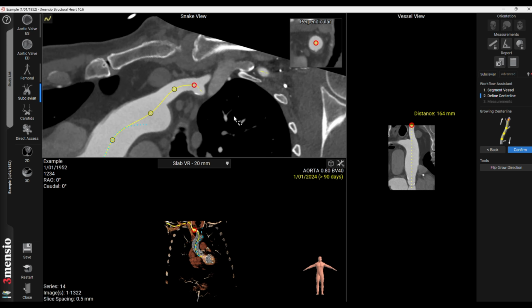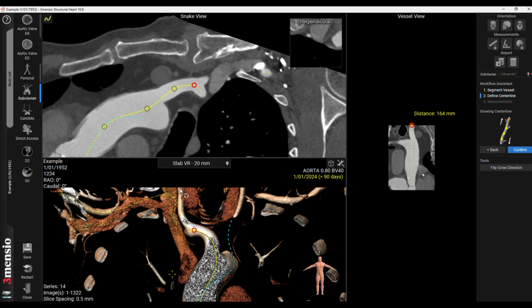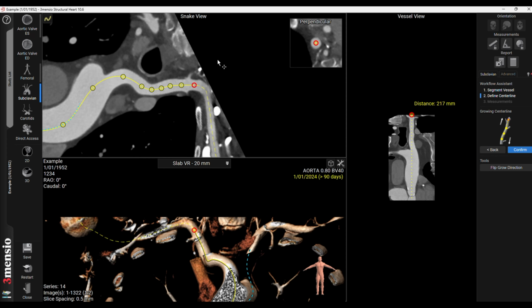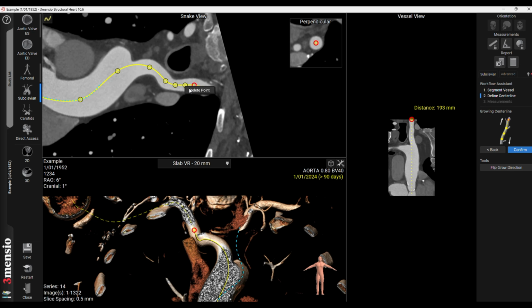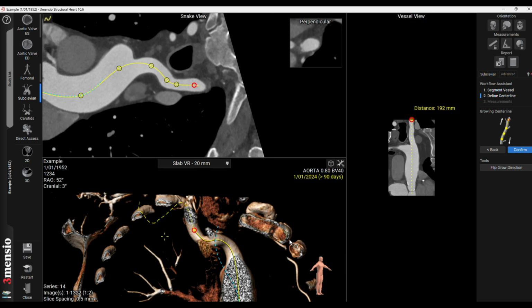And then I'm going to keep manipulating this top image up here to see where the vessel's going. However, this one, it actually has selected the subclavian. I mean, that is the workflow, so it's done the right one. However, I actually don't want that one. I want the carotid. Usually I'll do a right carotid and left subclavian for a workup as an alternate access if I see anything in the femorals that appears to be limiting or maybe not suitable.